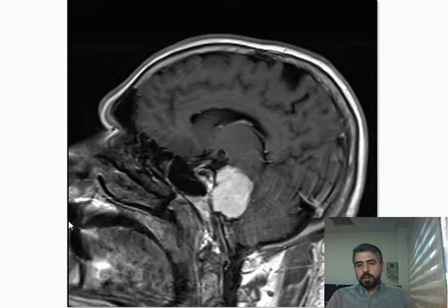This is another kind of meningioma. This is a clivus meningioma. You can see it's located basically on the clivus. This is a T1 sagittal contrast image, and it's showing dense post-contrast enhancement. It's compressing the brainstem and the cerebellum and the fourth ventricle, and it's not invading and not extending into the adjacent organs, indicating it's a benign form of meningioma, but the mass effect might cause symptoms.